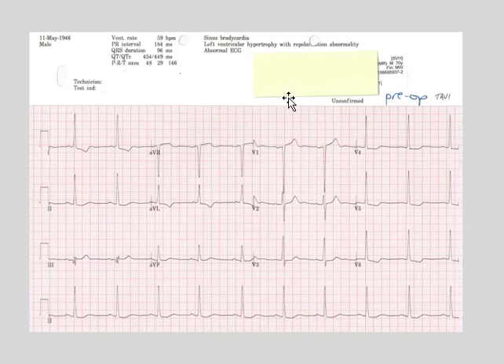In this one, I've deliberately left the labels so that when you revise this, you're not confused by what might be there, although always remember they may not be entirely correct. What stands out here? Regular P waves, regular rhythm, no axis deviation, any Q waves, possibly an insignificant little Q wave in lead 3, like V1 you ignore, although look at this is a potential Q wave, but it's only in lead 1 and it's isolated.